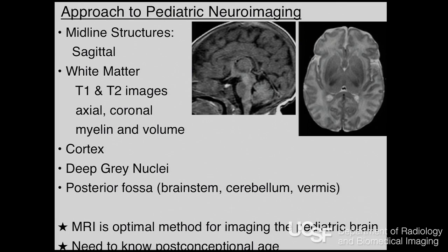And you can look at the brainstem, which is another indicator of white matter volume, and some genetic conditions can result in brainstem malformations. And then if you're evaluating a child for a suspected brain tumor, some of the more common locations are the suprasellar regions and the pineal regions, and again, those are included on your midline sagittal image. So it's a very helpful image to start with.